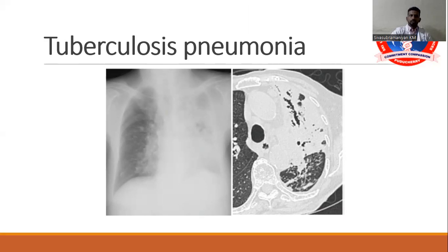And we have to remember tuberculosis when we talk of any pneumonia. And in India, it is very, very common. And you see such a massive area of heterogeneous haziness involving the entire left lung. And you can see some amount of shift of the mediastinum to the ipsilateral left side. And the right lung also shows some patchy areas of nodular opacities in the mid and lower zones in the pericardiac regions as well.